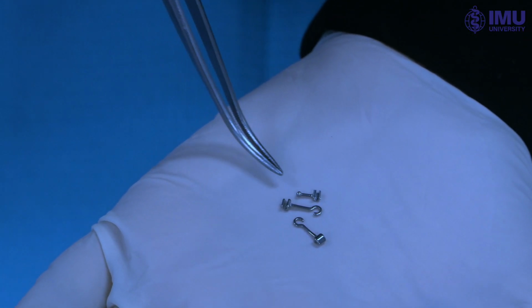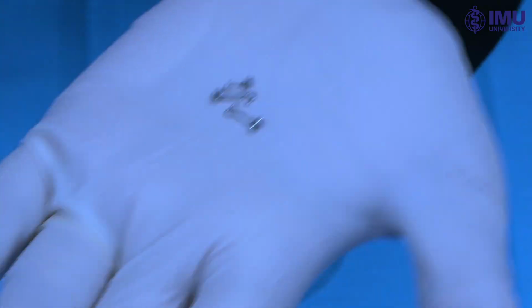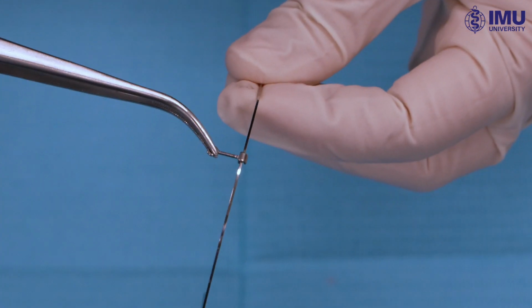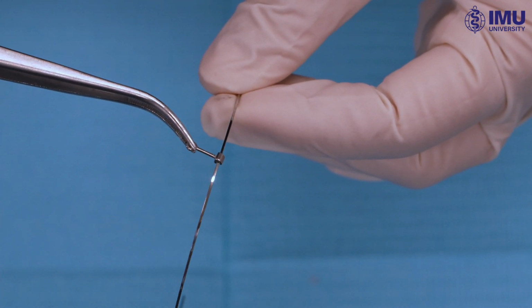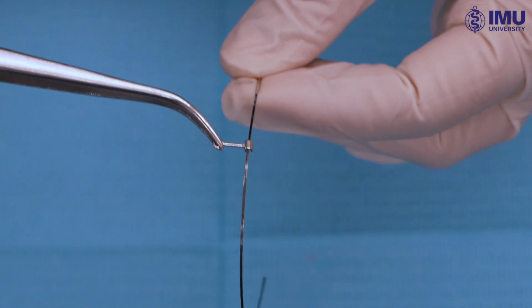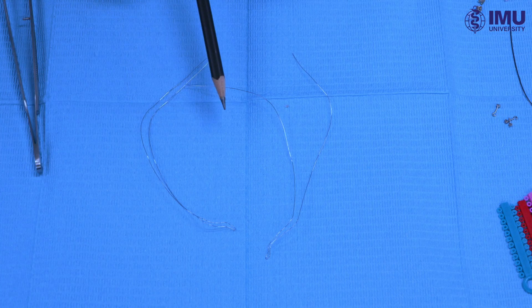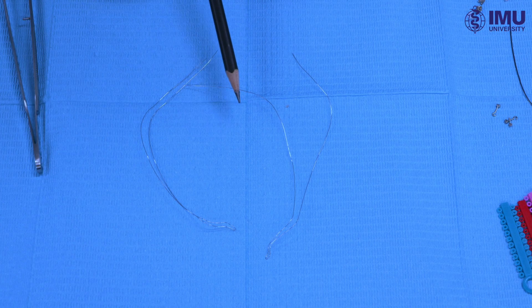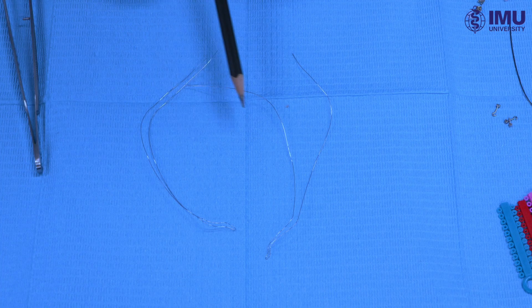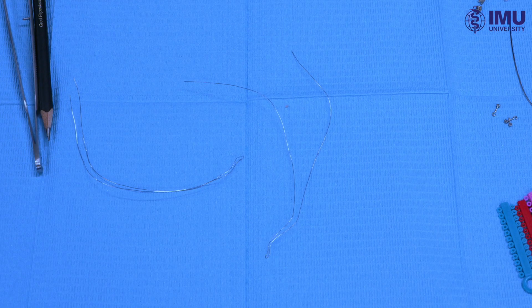Crimpable hooks are also passive component of fixed orthodontic appliances. Crimpable hooks can be crimped or attached onto the base arch wire where nitinol close coil springs or elastic chain can be attached. Ligature wire are the soft stainless steel wire of 0.008 to 0.010 inches in diameter. Ligature wire is used to hold or ligate the arch wire into the bracket.